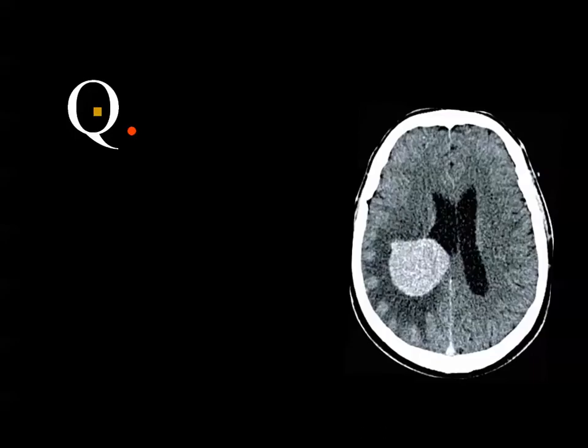Yes, the most common homogeneously enhancing intraventricular tumor in the atrium is the meningioma. And the meningioma will show most of the criteria of meningioma, like homogeneous enhancement, a smooth margin, and it may contain calcium. This edema around the tumor is due to entrapment of the occipital horn. The meningioma will occlude the CSF flow from the occipital horn, and it will diffuse around the ventricle.